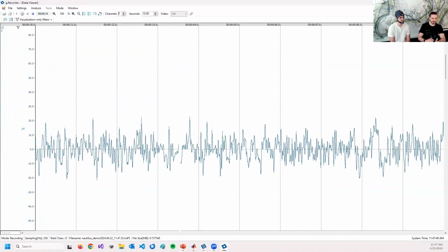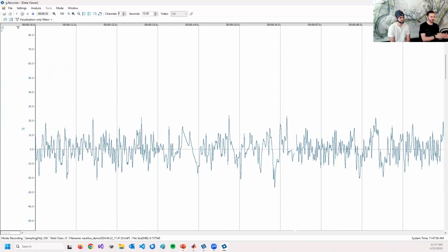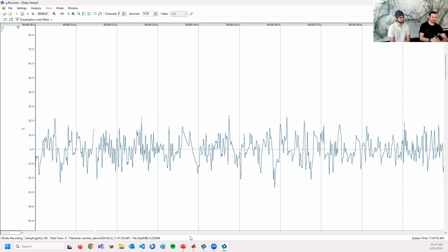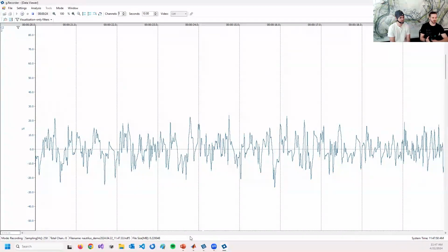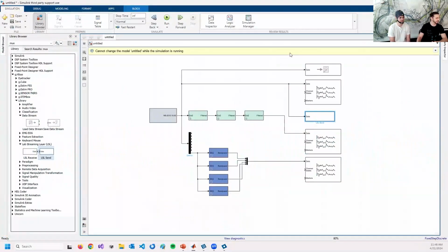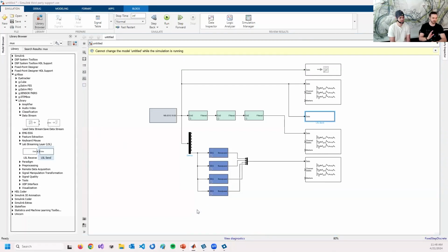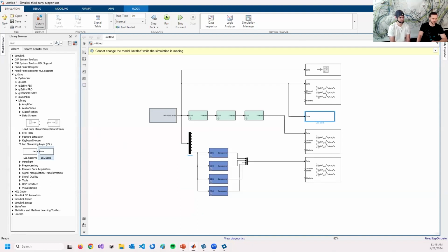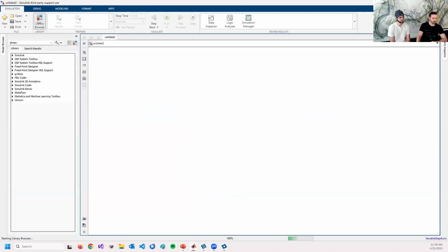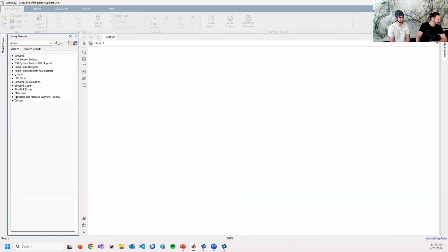And now the use case would be that you're in a clinical environment, you're running your data acquisition in g.recorder, and you want to process data within a research tool to run your research experiment in parallel. And therefore, we could go to g.tec again and just leave the data acquisition running in g.recorder. I'm creating a new model. And I'd like to add some data visualization again.